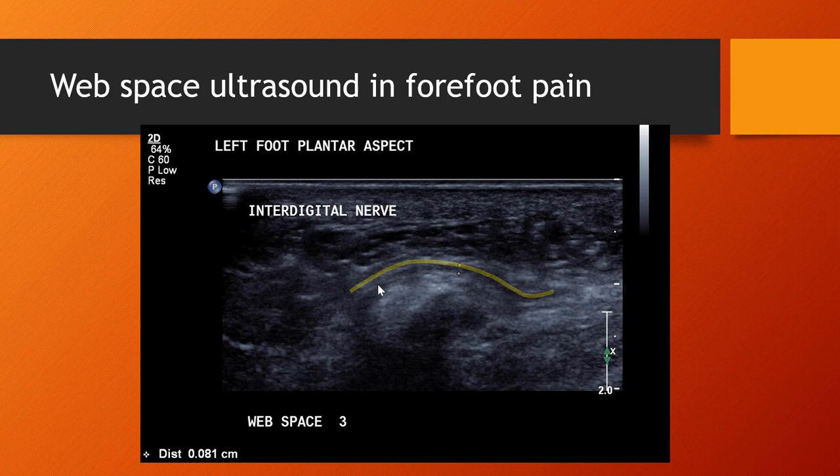The difficulty with MRI is that the nerve can be masked by high signal from adjacent effusion or capsulitis or periostitis. The benefit of the ultrasound is it's dynamic. Traditionally the MRI diagnosis was made in a transverse plane, looking for a teardrop-shaped bulge from between the metatarsal heads. That can be a sign that's quite easy to see and appreciate on ultrasound. However, that teardrop shape can be from bursitis, and quite often it's misdiagnosed as a Morton's neuroma when it was still at the bursitis stage.